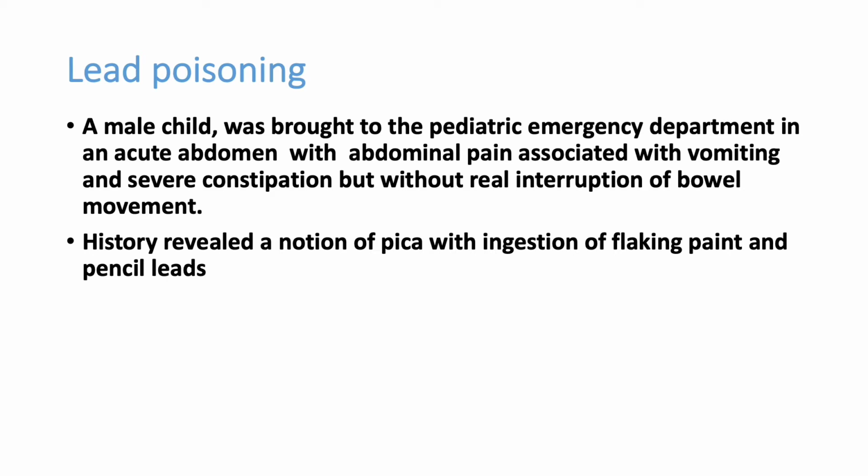It's a male child admitted to the pediatric emergency department with acute abdominal pain, vomiting, severe constipation. This patient had a history of pica, of ingestion of flaking paint and pencil leads. This is one of the classical presentations of lead poisoning. Nowadays, most of the paint brands do not contain lead, so lead poisoning from paint is not very common, but pencil leads can create problems, especially in children.